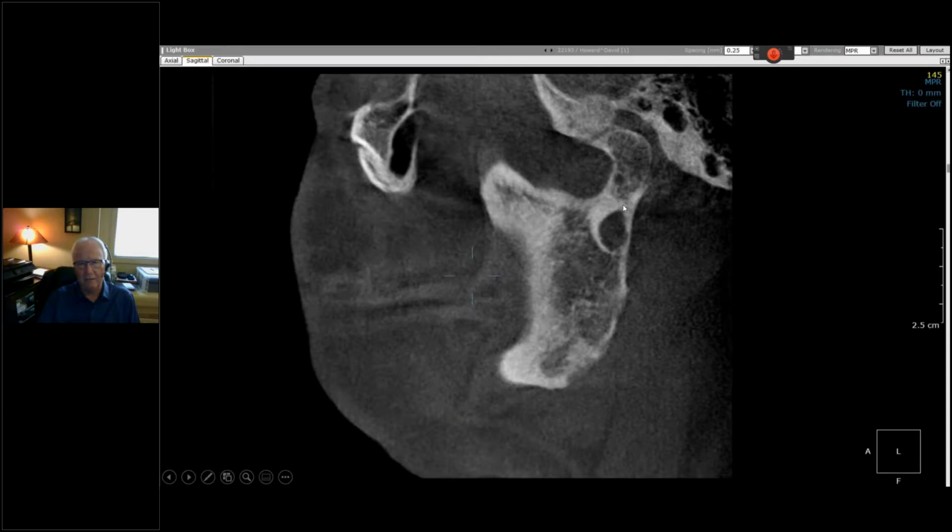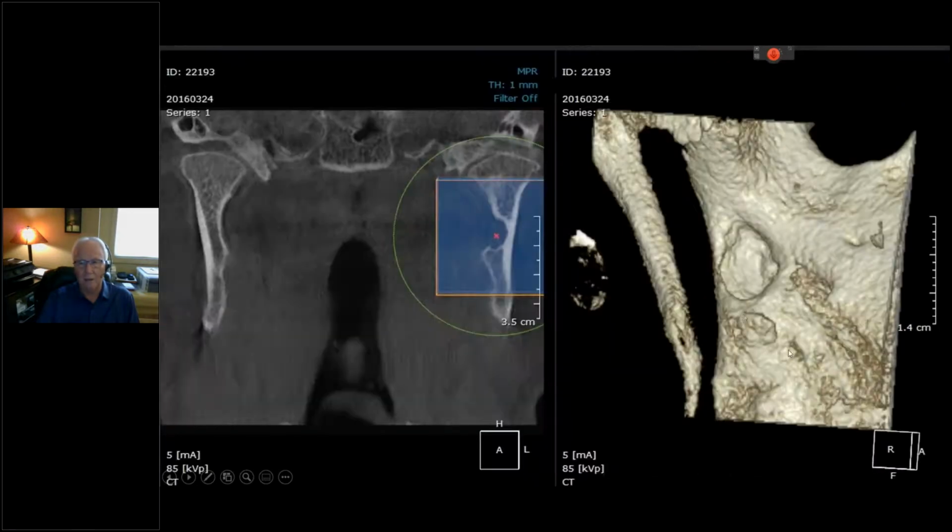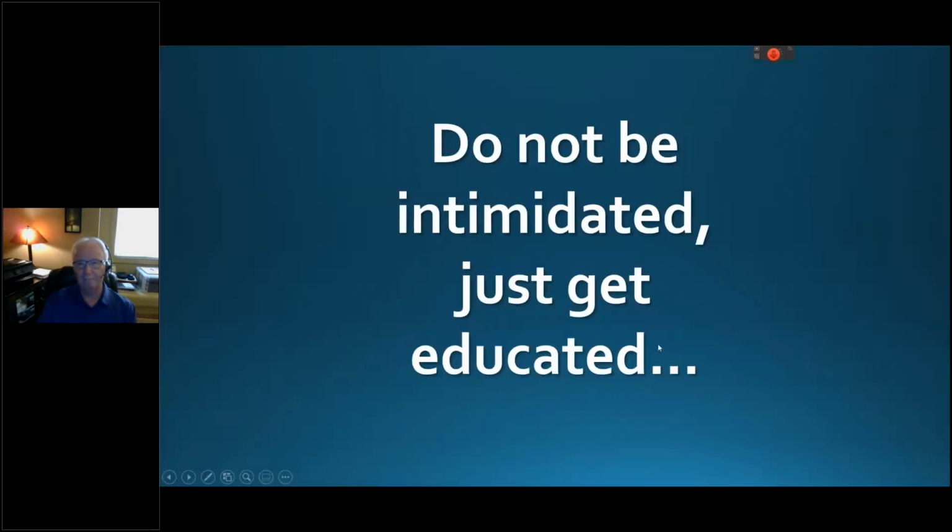And you can see the first image that I did had a radiolucent area here. There was another radiolucent area here. I'm now thinking well-defined punched out radiolucencies, this has got to be multiple myeloma. It was not. We did the 3D reconstruction. It's not so much punched out, it's a salivary gland defect. This is where the parotid lies. The parotid lies on the outside here, but wraps around the back of the mandible. And so this is a variant of a salivary gland depression that happens to come from the parotid.